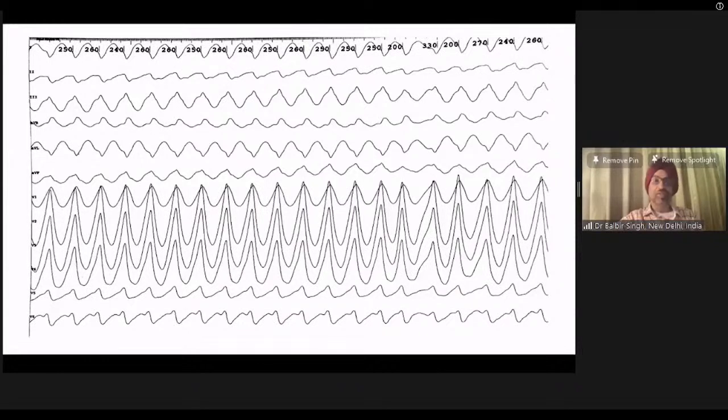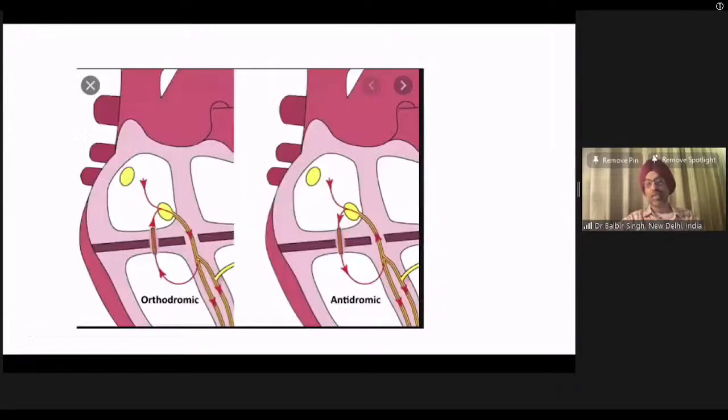So we did the first. This is the regular tachycardia with 1:1 VA response, similar to what I showed you in the clinical example. In his actual clinical presentation, this is exactly what he was having. As I was mentioning, antidromic tachycardia classically has the impulse going down the pathway and coming back on the AV node. But you can only distinguish it by doing maneuvers, which is atrial and ventricular pacing.